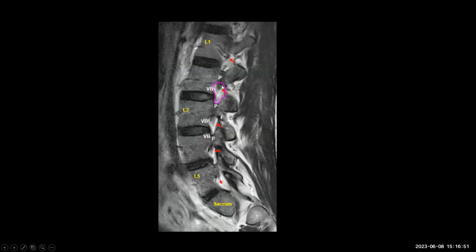So this is the exiting nerve, the vertebral body, the pedicle, and the keyhole sort of an appearance. So this keyhole appearance is the thing that you need to see. If it's preserved, that's good. When there is mild stenosis, you can see part of the lower part going, and as it goes moderate, the superior part gets encroached on, and in severe stenosis, there's total loss of this keyhole appearance. So this is quite the best plane to look at anything which is happening in the foramina.